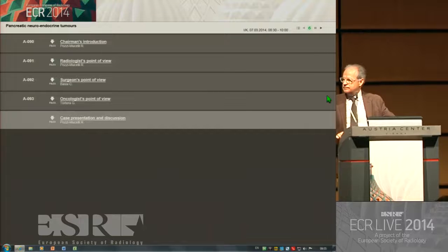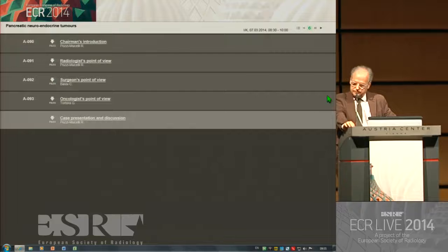So we ask you to do the same for this type of lesions: to look inside, rather than only at the dimension, the bidimensional measurements. Sometimes you see a shrinkage. In some cases, renal cell cancer for instance, you see big shrinkage. But in other cases you don't see a shrinkage, but you see a change in the architecture with a lot of necrosis inside, and that usually corresponds to an increase in survival. Prego.